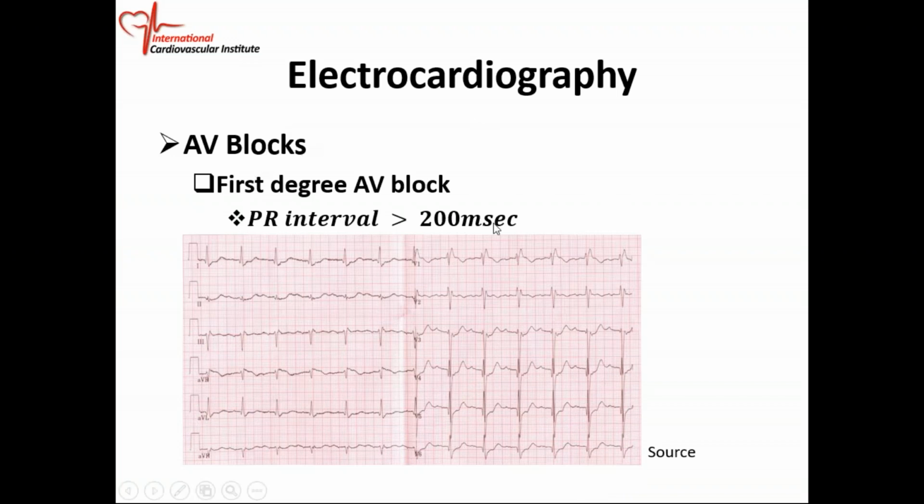And so you get your 12 lead EKG. You know how to read EKGs now, because sinus rhythm means you have upright P waves in leads 2, 3, and AVF. So it's a sinus rhythm. But when you check your PR interval, this is much greater than 200. Remember, one big block is 200 milliseconds. The little tiny blocks are 40 milliseconds, and you have 5 of those tiny blocks in a big block. So your PR interval is from the beginning of the P wave to the beginning of the QRS, and you measure it. If it's greater than 200 milliseconds, you have first degree AV block.